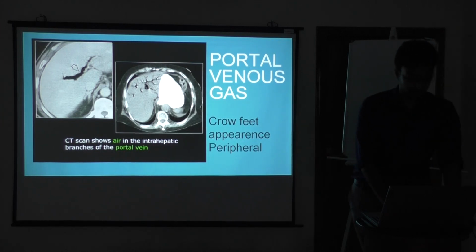Because of gravity, gas usually collects in the peripheral areas. So this is one thing. And let's say there is CBD cannulation, then you can see gas, but the gas is in the CBDs.